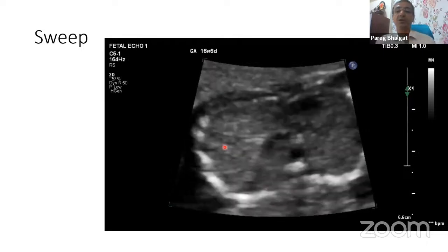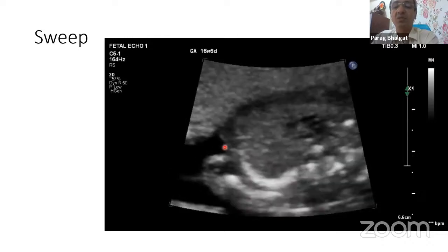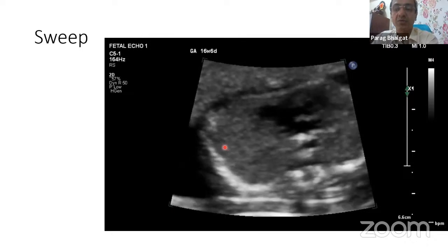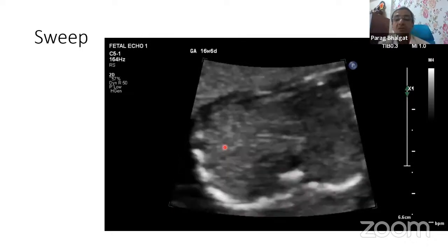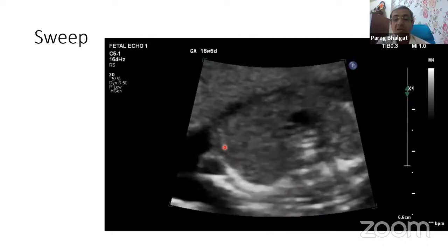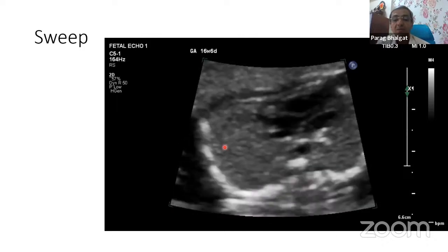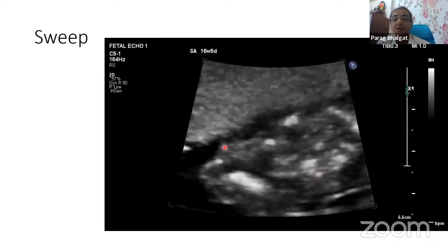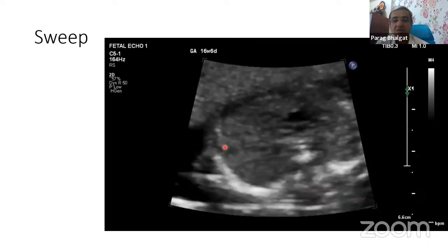This is a sweep for us to understand the relationship. Just try to go through this sweep 4-5 times. I'm going to run it for you 4-5 times so you understand the segmental anatomy in a better way. So left aortic arch, AV concordance is clear, and aorta is big, PAs are small. Aorta looks arising from RV, DORV-like substrate. Also note fundic bubble and cardiac apex are on the same side, most likely a situs solitus substrate.